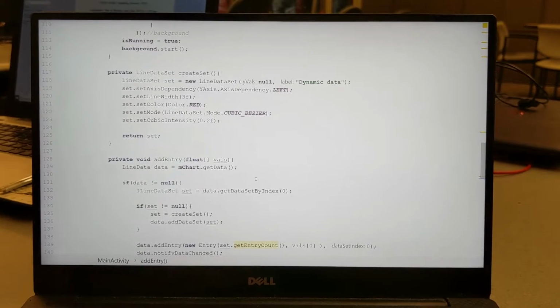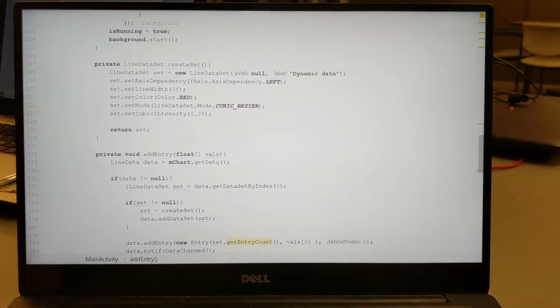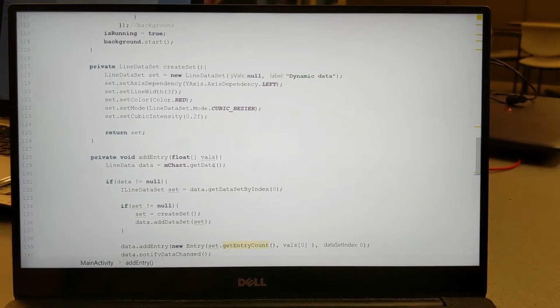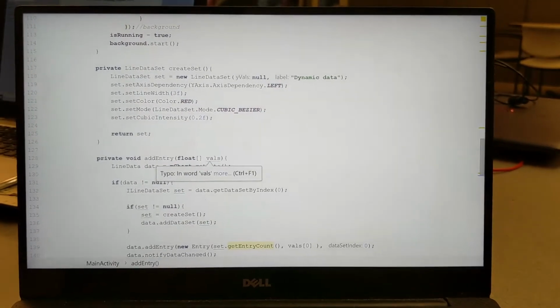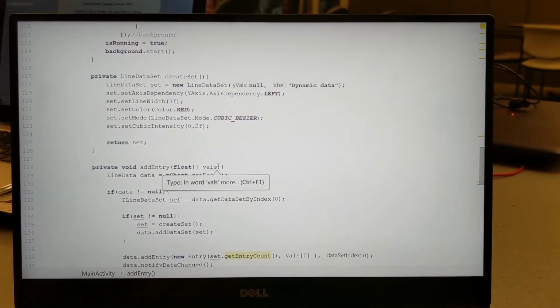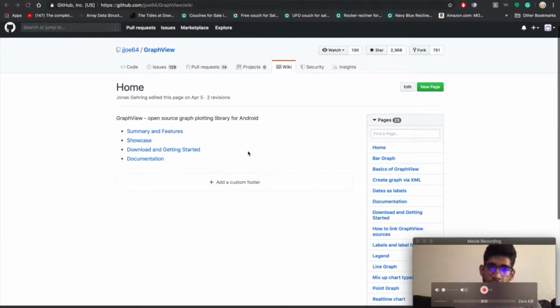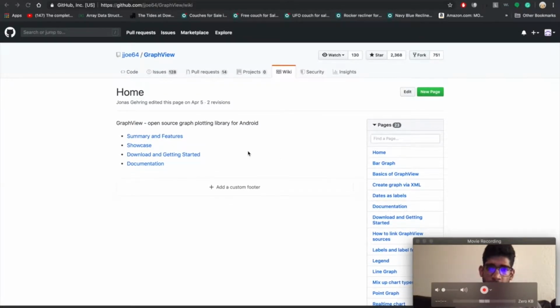So unfortunately, this was giving a few errors, and before we could fix it, Harsh was able to implement the graph view using the GraphView library, and so we have to discard this parallel work. My name is Harsh Lalwani. So my basic task was to implement the graph that shows the heartbeat, and how we are doing it is that we are using a third-party library here.